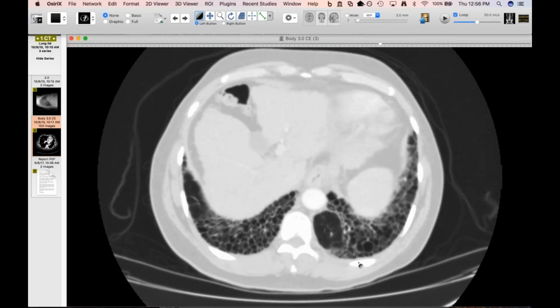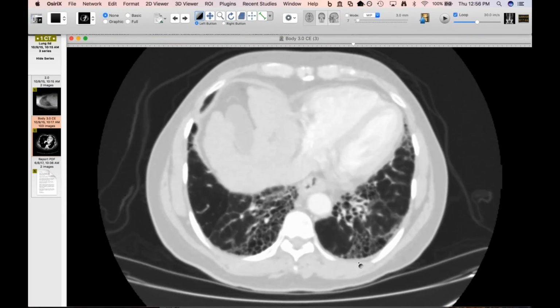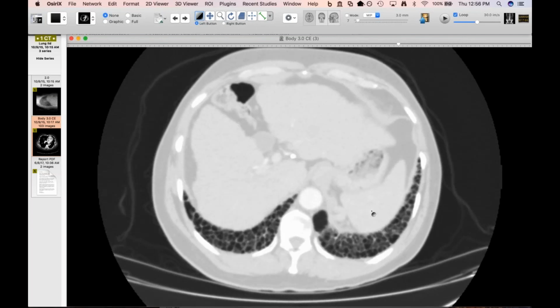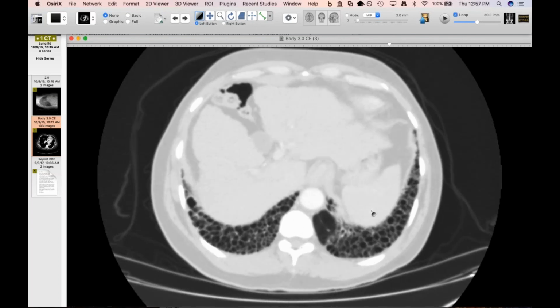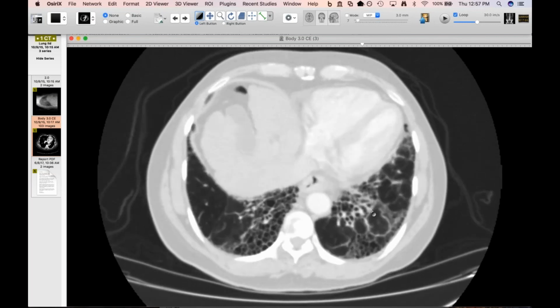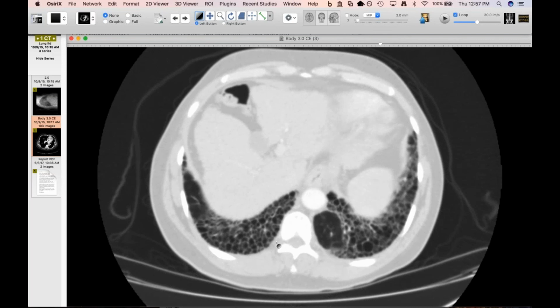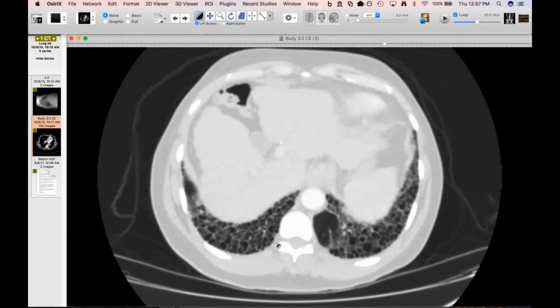Yeah, it is very similar. The other situation where I'd seen this really floridly in the upper lungs along fissures was in burned out sarcoid. Not with a lot of distortion. It wasn't just bullae and scarred up lung, but rows of these thin-walled holes along pleural surfaces, upper lung predominant. Yeah. So you wouldn't want to call it a UIP.